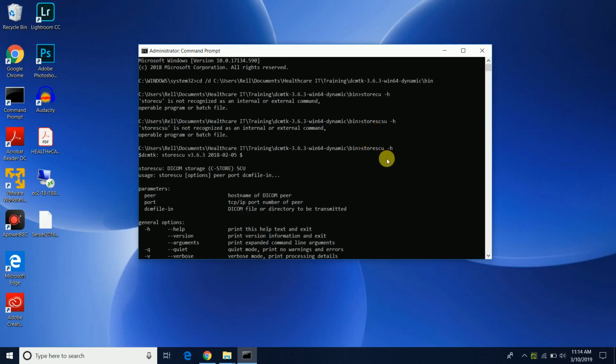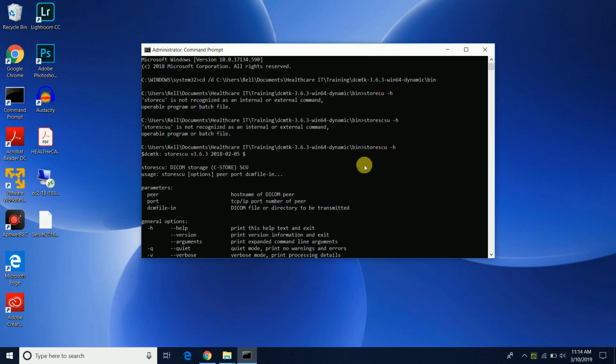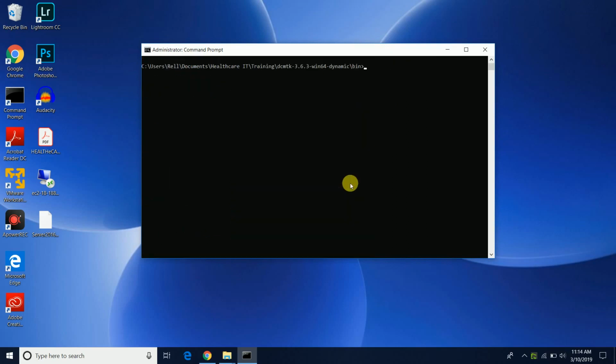Pardon me. Let's just clear that and run that again.